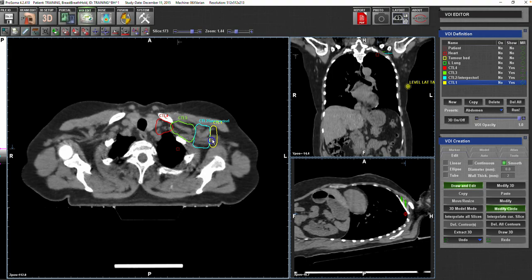And then you will extend. You see that there is a pectoralis major muscle here, so go to the lateral edge of the muscle, something like that. But then you don't know where to go. I was just talking to you about digging into the space between the teres major and latissimus dorsi. We don't do that. We will just be at the edge, what they call in the guidelines an imaginary line. So don't take the thoracodorsal vessels.